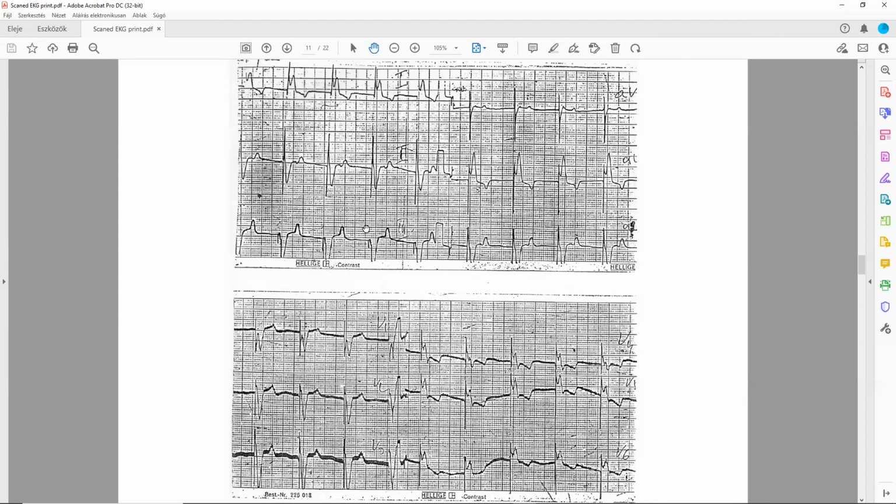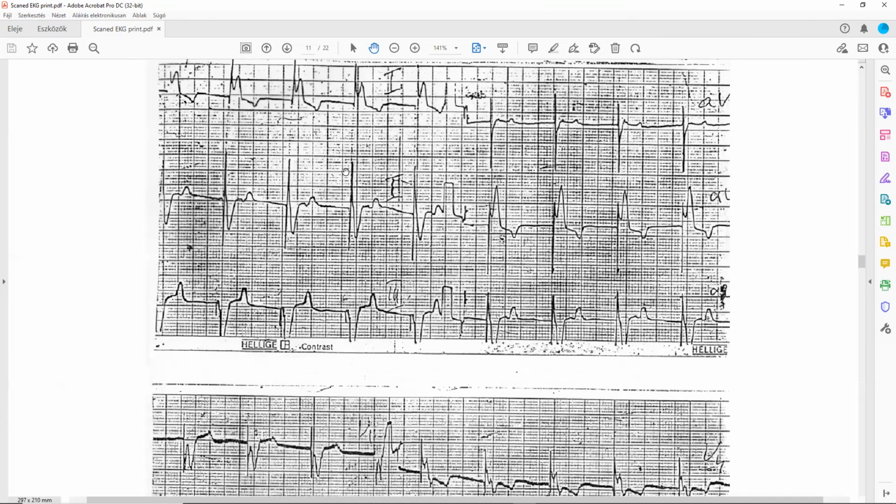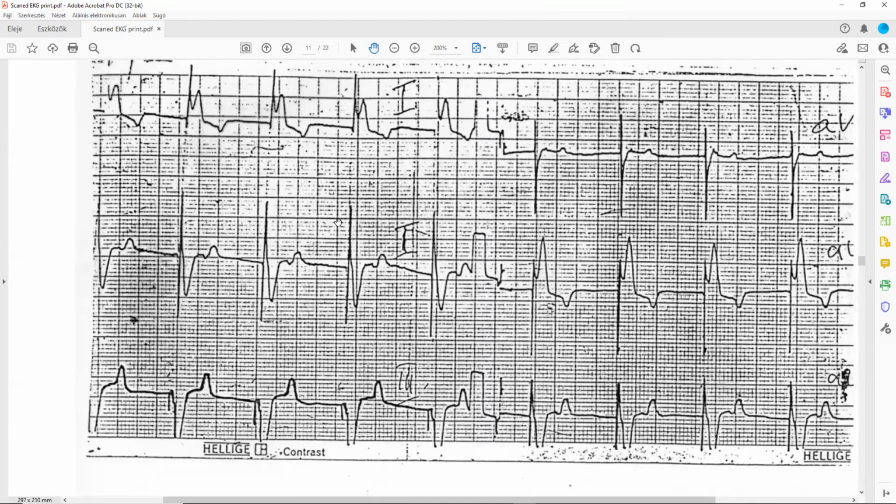I don't see a P wave for each one. Yes, no P wave. What does it mean when we do not have any P wave? It means maybe like a sinoatrial arrest or something. Meaning that we don't have any sinus activity. So it can be a 3rd-degree SA block, or basically no sinus impulse formation. Only what we have is a QRS complex.